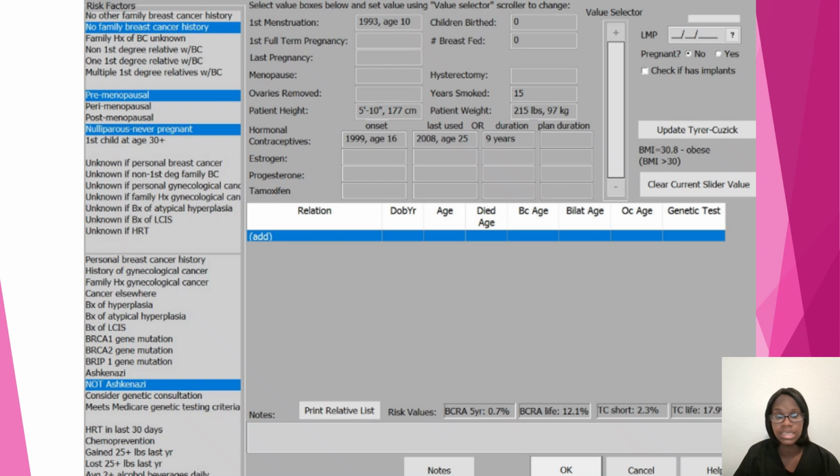With Parkinson's disease, some patients cannot hold still. A lot of them can, but I'm just saying, for instance, if someone cannot. And then you can put patient had breast implants removed. So these are different examples you can add under notes. Patient unable to tolerate adequate amount of compression or positioning.